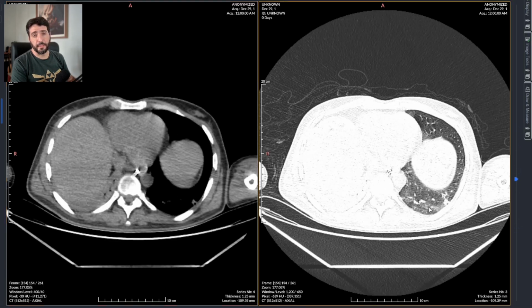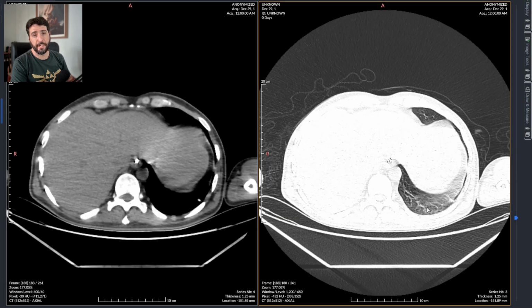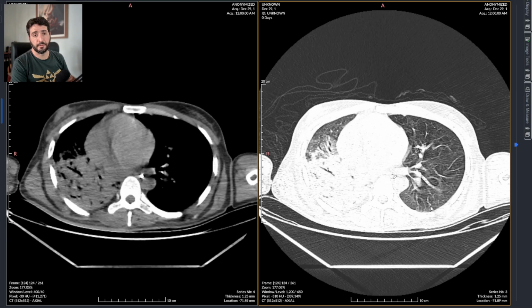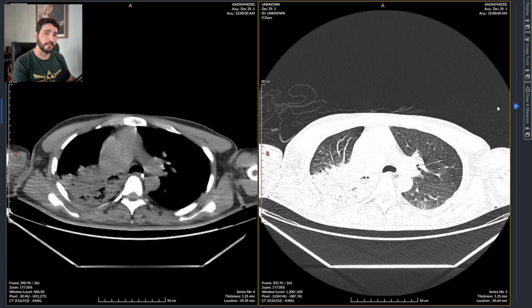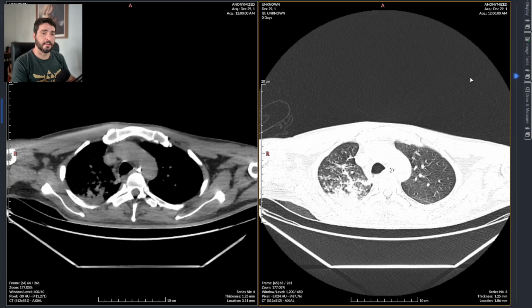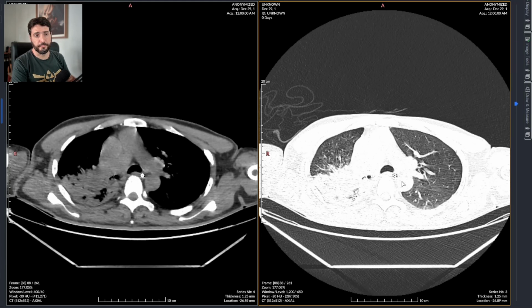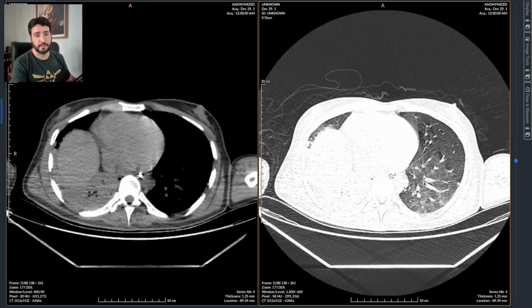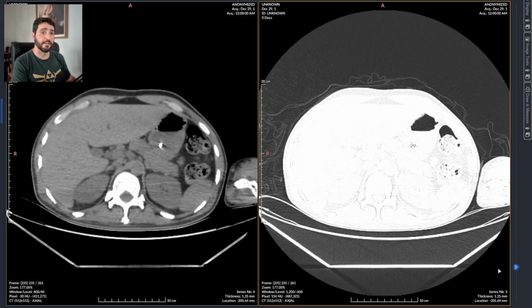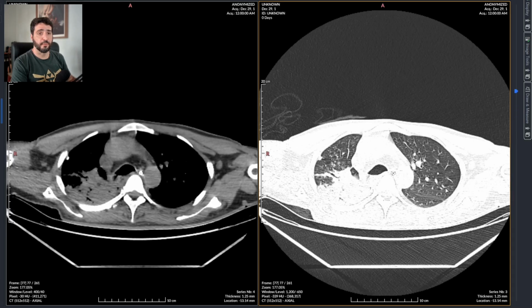But on the other side, on the lower left lobe, we already have some small consolidations. The upper left lobe isn't clearly affected. We also can see that they have already installed an esophageal tube for feeding to protect the airways, because this patient is going to be staying in the ICU for a long time to treat this major pneumonia.